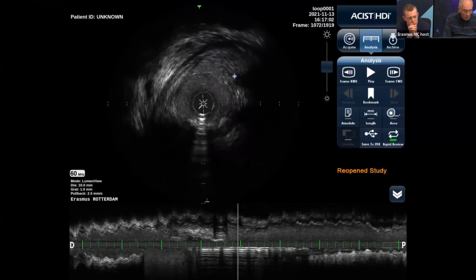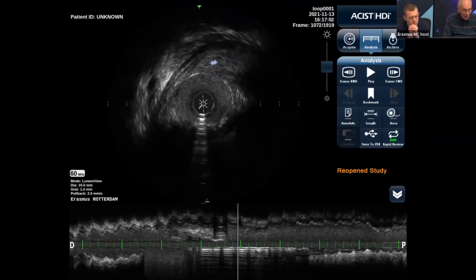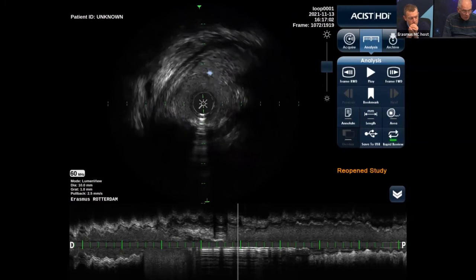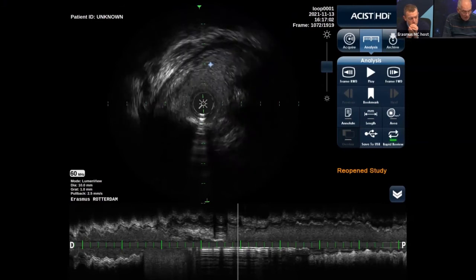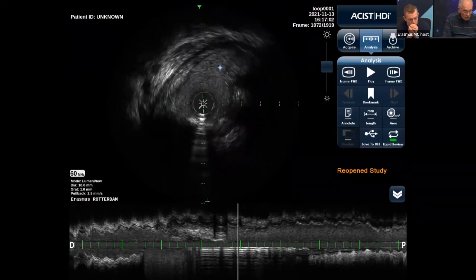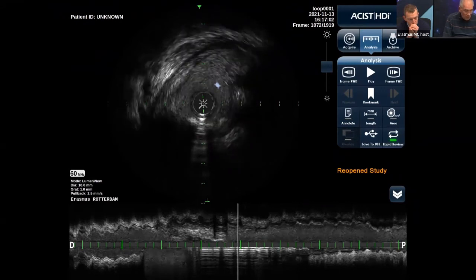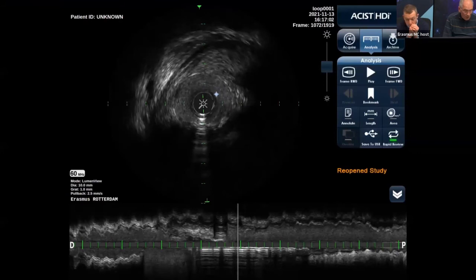This used to be, before the plaque rupture, a massive plaque, but here the fibrous cap was broken, and then because of the plaque rupture, there was probably necrotic material, inflammatory material, and that is very thrombogenic, so that immediately we get thrombus.